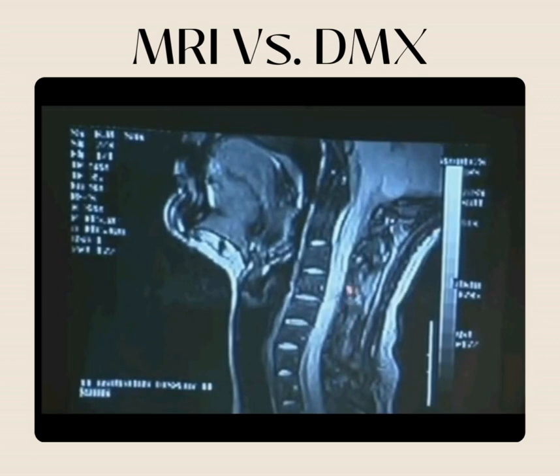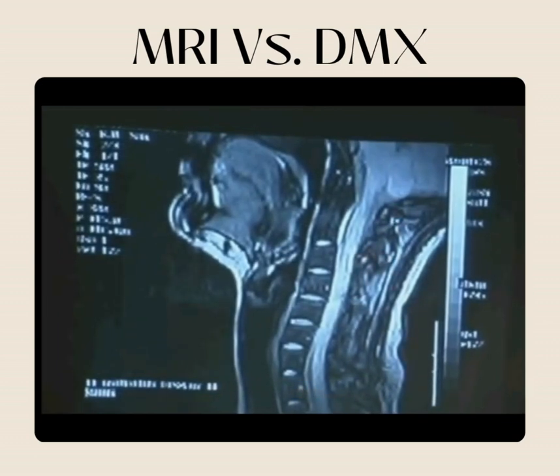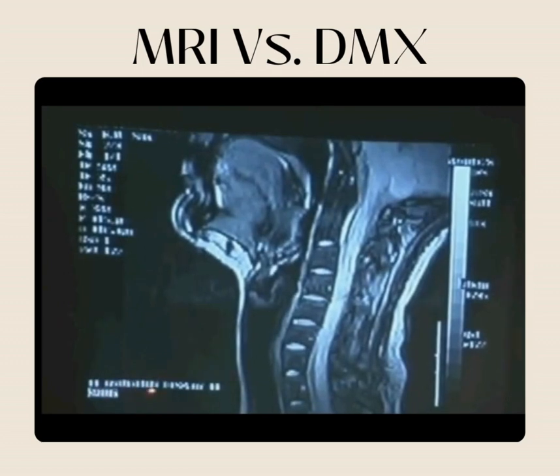This is the back of the neck where the facet joints are, right and left. Can't see them. Again, the person isn't standing, they're lying down. And they legally have to put animation on here because it's that looping together.